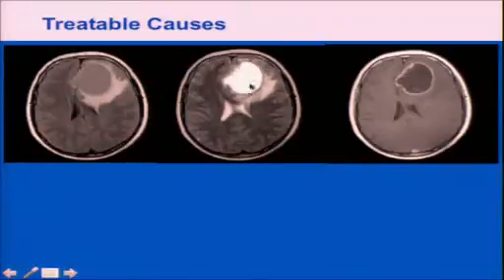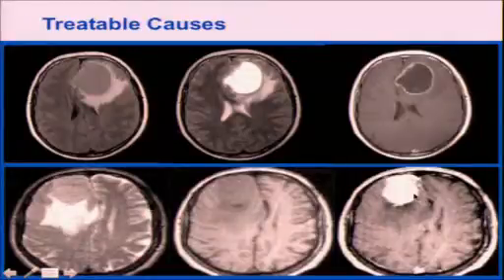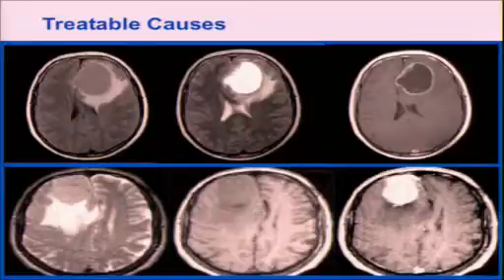Of course, the patient had other symptoms and finally died from this disease. Another patient here, an older patient, again has a large, in this case extraaxial, lesion. So a meningioma again, and after successful resection, complete resolving of the dementia symptoms.